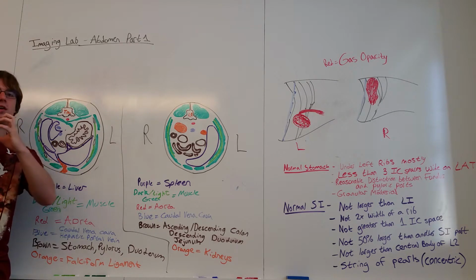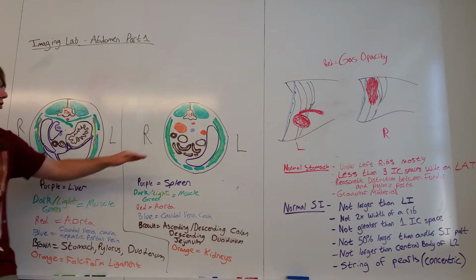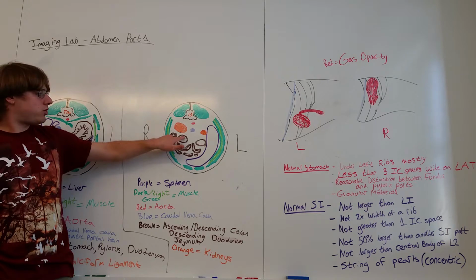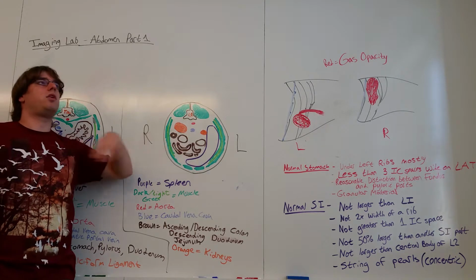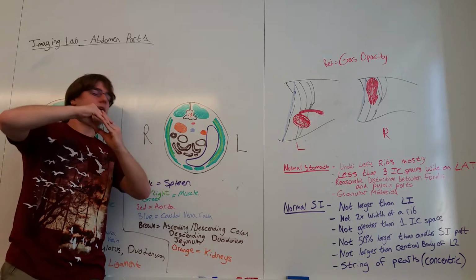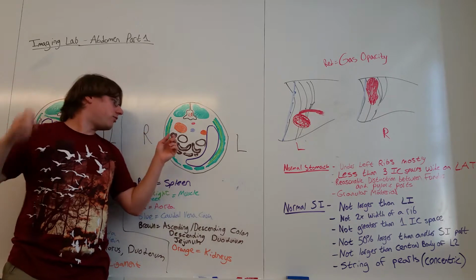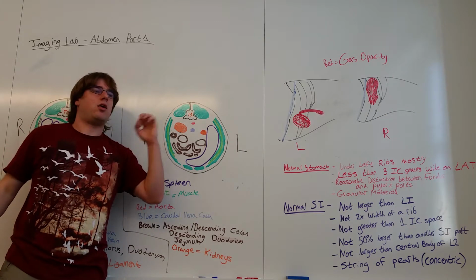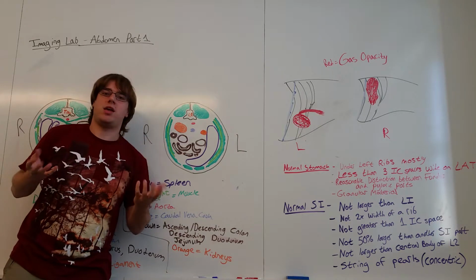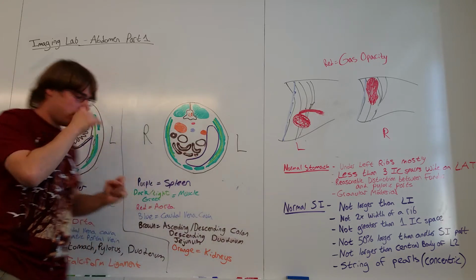It's very thick around the lumen, whereas the colon, if we go to a more caudal view, has a more squiggly, compressed lumen with a much wider space. So I think of the duodenum like an artery, and the colon more like the contours of a vein, which we saw were more compressed and much wider with thinner walls.